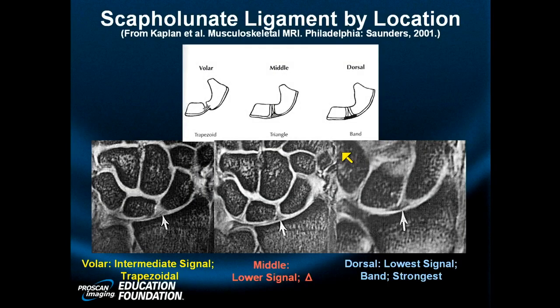The intrinsics. Now, when I put up a coronal, one of the first things I do, besides looking at bone shape, conformity, relationships, angles, is I look at things that are commonly abnormal that they're interested in, like TFC, TFCC, abutment syndrome, variance, SL ligament, LT ligament. That's my first 10-second dive onto any series of coronals. I'm not going to miss a fracture. It's too easy.